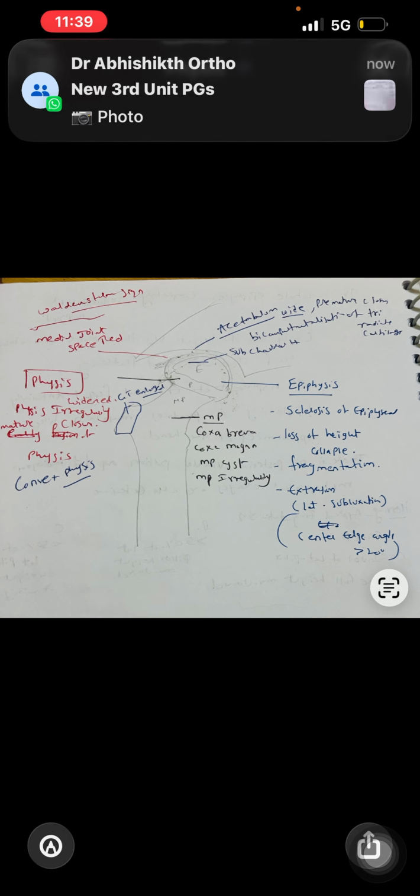absorption of the involved segment followed by degeneration. In the second group, the anterior part of the epiphysis is involved with collapse, but height is maintained due to the medial and lateral pillars, and there are no metaphyseal changes. Type 3 is where the entire femoral epiphysis is involved except a small portion of the posterior epiphysis, and the remaining part is sequestered, and there is a head-in-head appearance on AP radiograph, and collapse is present. Extensive metaphyseal changes are present in groups 3 and 4 with a wide and broad neck. In group 4, the whole epiphysis is completely sequestered and collapsed.